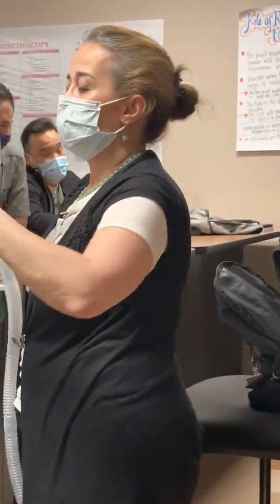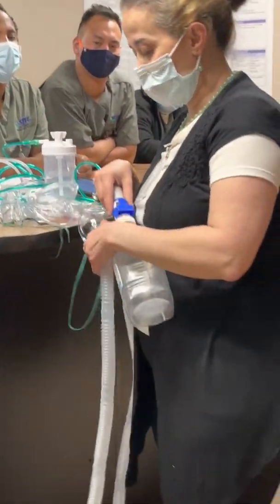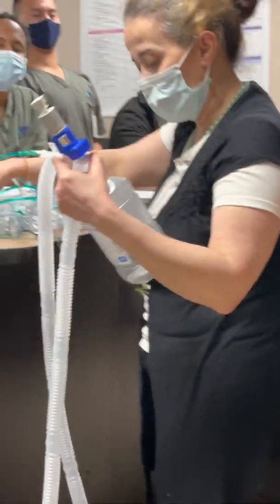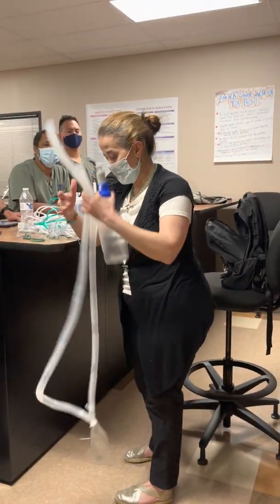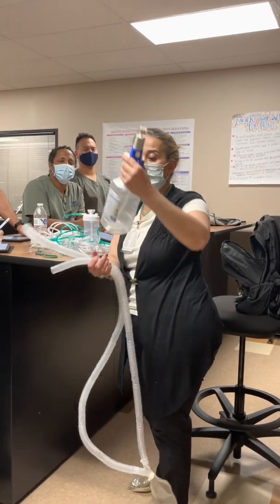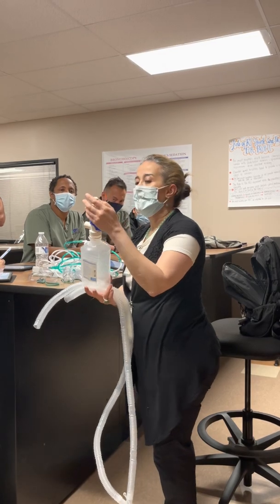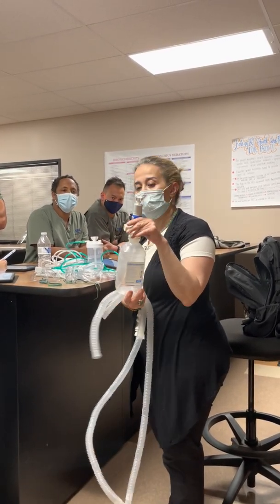This one is aerosol mask. So when I want to extubate the patient in ICU, I grab all of these. These are all separate. You need this. You need 2 pieces of this tubing. You need this bag, and you need this. There are so many different types of this. Some of them are high flow, some are low flow. Depends if you twist them, has opening, which this one has, so it's probably high flow.